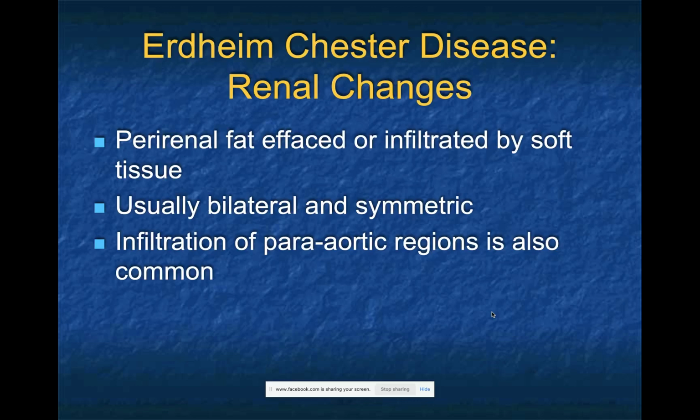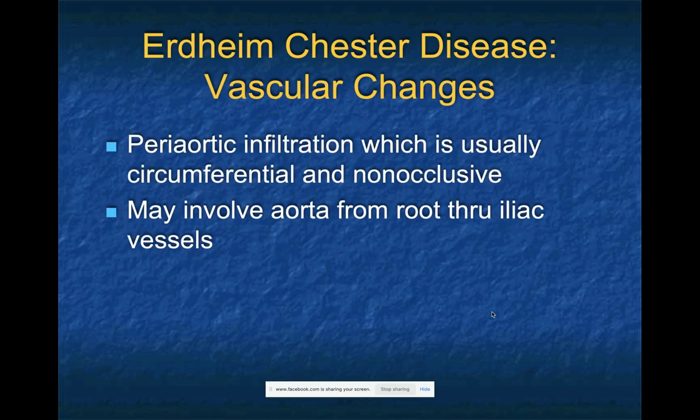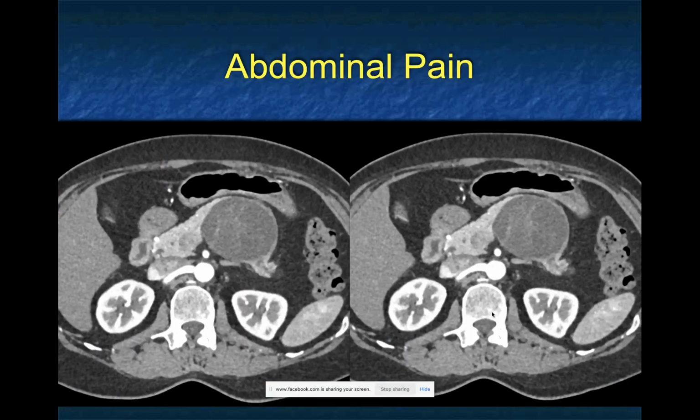Again, renal changes, as we mentioned. Without the aorta, you would have a bigger differential diagnosis. With the aorta, you're going with Erdheim-Chester. Another patient, cystic lesion of the pancreas, and I showed this case in conference this morning. Cystic lesion in the body, septations. If I told you the patient was a 45-year-old female, you would say, aha.